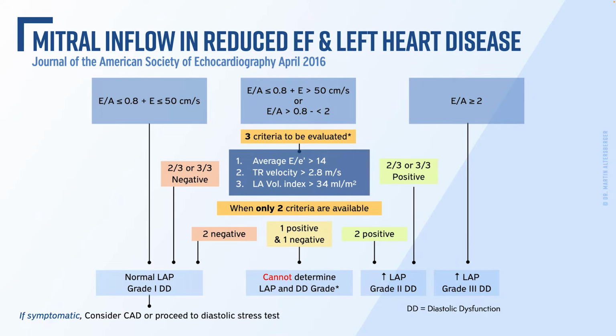Other considerations we had before the recent guidelines of 2016, the pseudonormalization, the impaired relaxation, that is not an accurate definition of diastolic dysfunction anymore. So you should stick to basically those measurements and definition of, is there an elevation in filling pressures present? Which grade of diastolic dysfunction do we have? Again, that being said, I'm a huge fan of defining, do we believe in our echocardiogram if filling pressures are elevated or if they are normal.